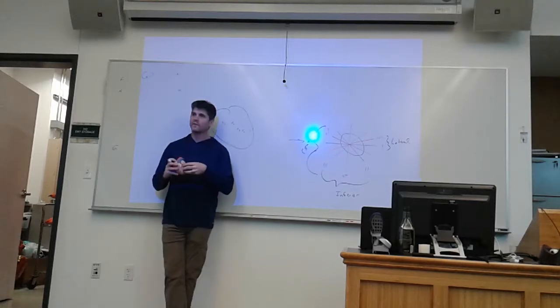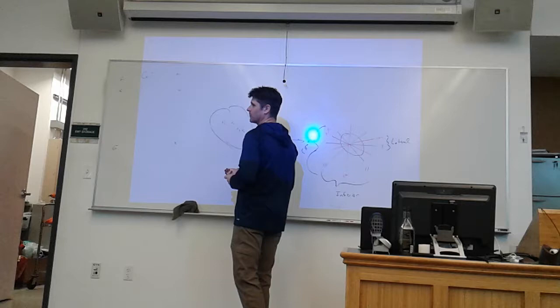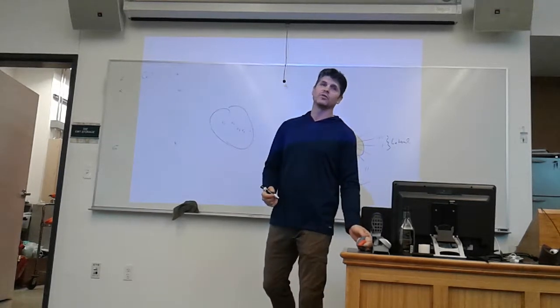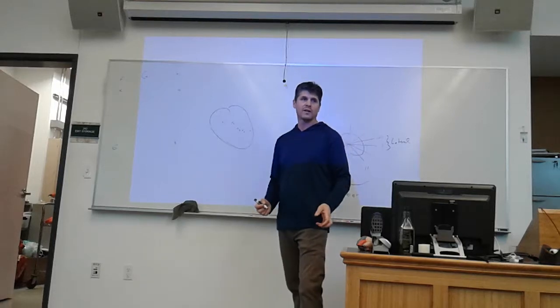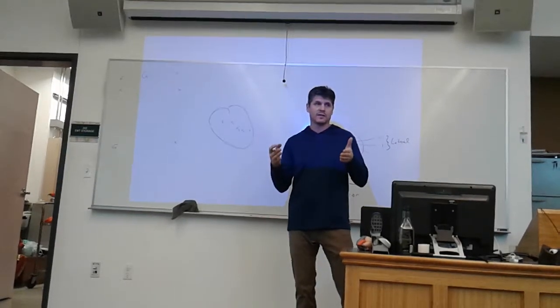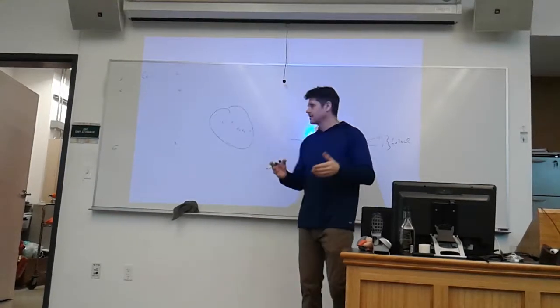Then as we go around with V5 and V6, it's looking at what portion of the heart? The lateral again. V6 and lead 1 look at the exact same portion of the heart. The depth at which those two leads look is different, but what it's pointed at is the same.